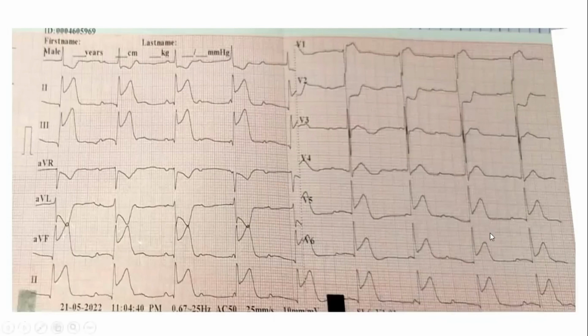So as you can see, the ECG is very obvious. Again, you are seeing an ST elevation that you are used to seeing. Now look at these types of elevation. Look at the previous one which I showed you, and now look at this. Although over here you can see what you are used to seeing in your practice or in your training, this is no doubt an inferior wall MI.